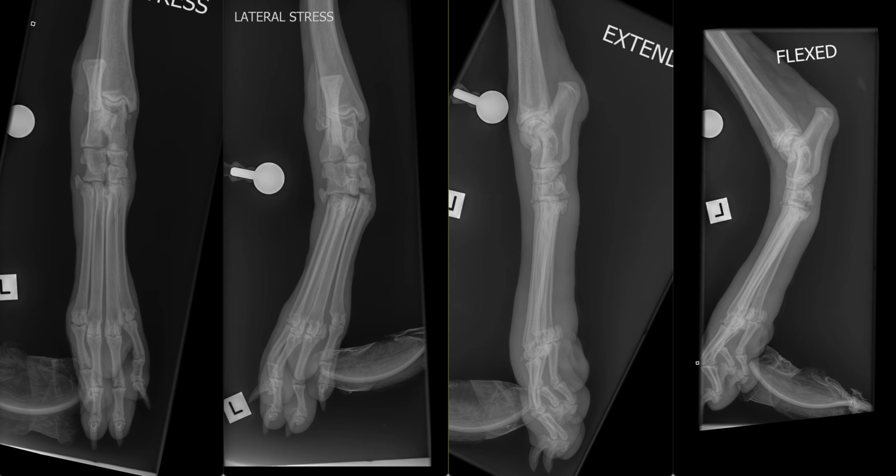There is severe associated soft tissue swelling, which can represent both hemorrhage or edema. The findings of this study are consistent with plantar and medial instability, and this can be due to ligamentous insufficiency or loss of stability across the joint space from the fractures that are present, effectively creating laxity in the ligaments that are providing support to the osseous structures.